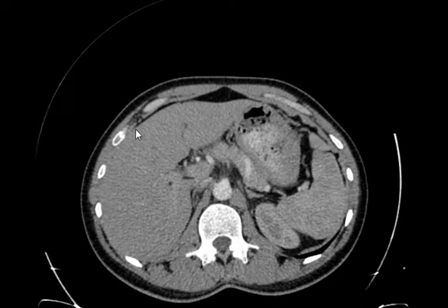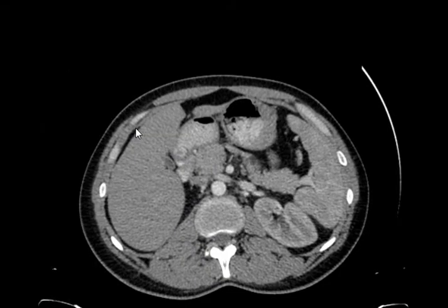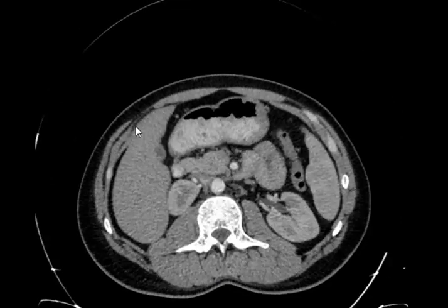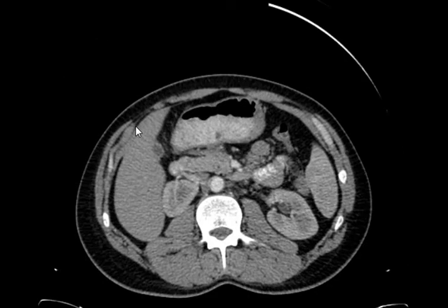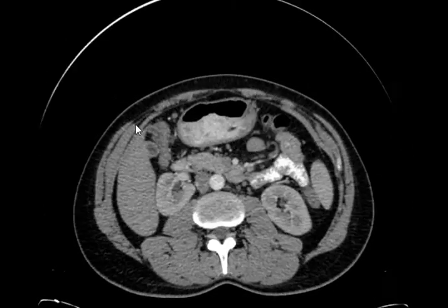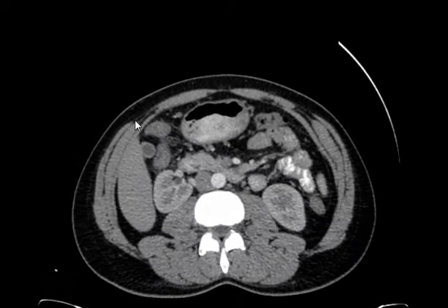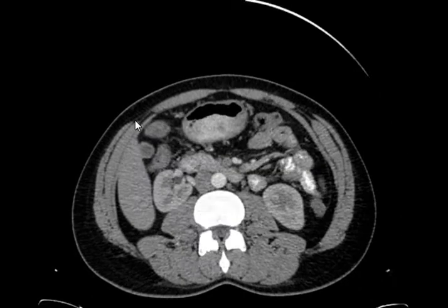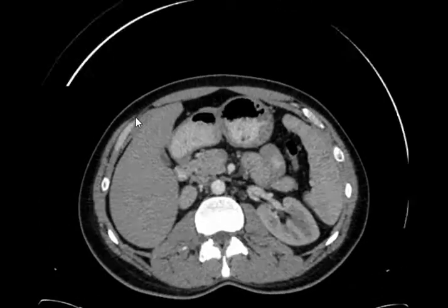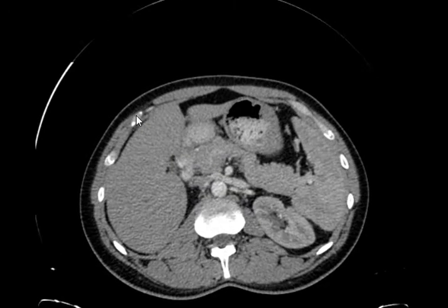So this is CT of the abdomen and pelvis, showing with or without contrast. With contrast. What kind of contrast, oral or IV? IV contrast. Okay, oral or no? There is oral. So it's oral and IV. Liver normal. Okay. Pancreas normal.